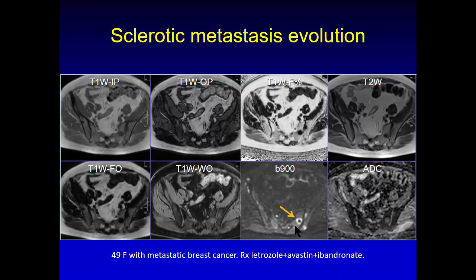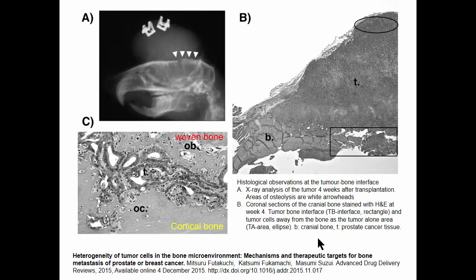And here is another patient. There we go, a small area of mineralization right in the center. Peripherally, hypercellularity. That's where osteoclastic activity is going on. That's where the tumor expansion is going on. Okay. And you could show this, in fact, on animal experiments.